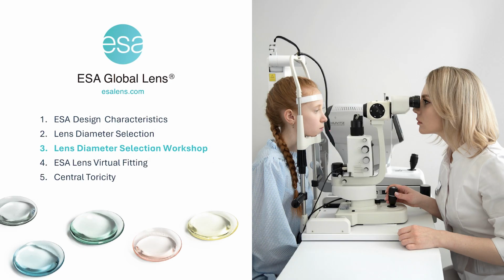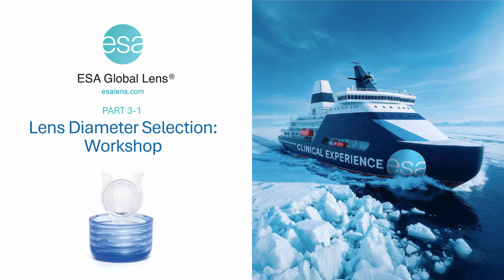Now that you understand the criteria for assessing lens diameter, let's move into the practical application we discussed earlier. These are all real-world clinical cases. Let's begin by examining the first 10.